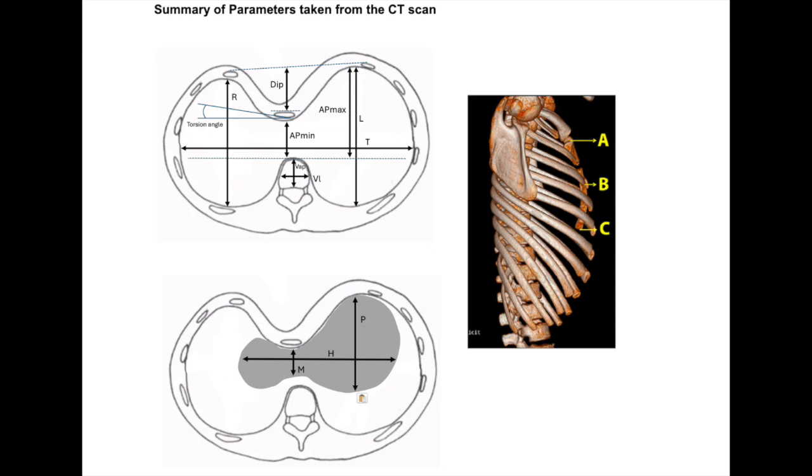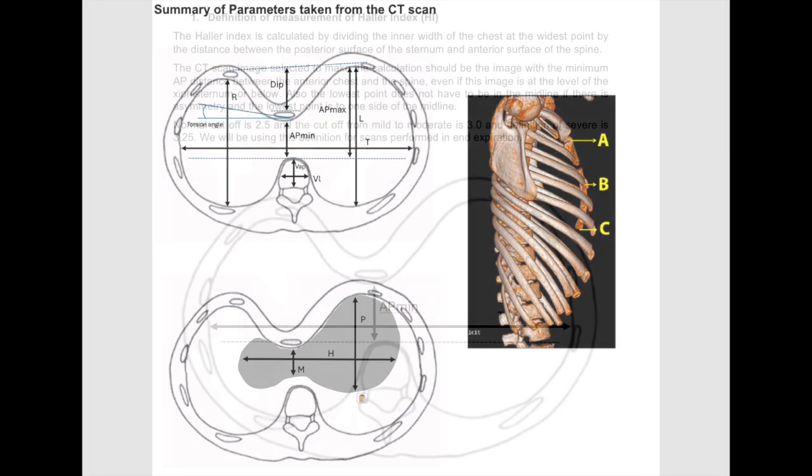In this video, we're going to explain to you all the parameters that we hope to collect for the restore trial. We're providing this interpretation by a picture, and we also have an Excel-based collection tool, which I think you'll find useful, and I'll go through in the second part of the video. But first of all, I'm going to go through each of the parameters and how you collect them.